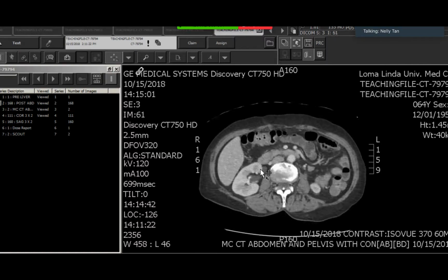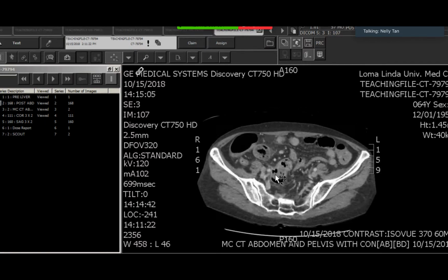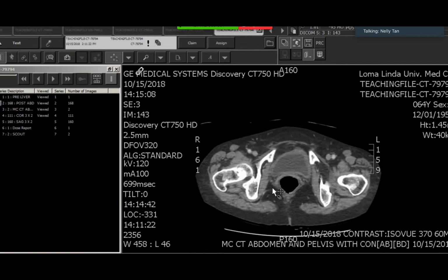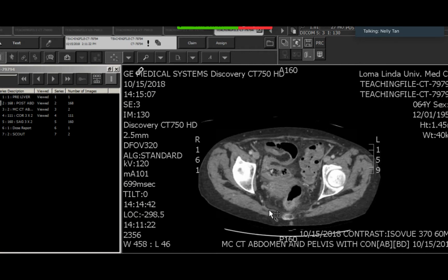Bright red blood per rectum, the GI symptoms. So this was the first initial presentation. There was no known liver mass at the time, but this was the initial CT that we got, and I read the CT. And I thought there were abnormalities in the bowel.